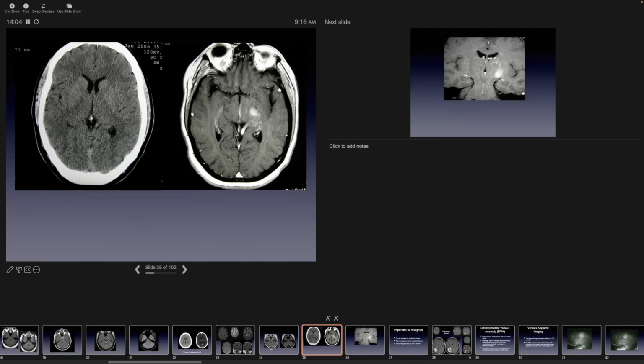A second option is to do one of these MR tagging scans where you can determine if there's AV shunting. Not typically done, but you'll notice on susceptibility weighted imaging, oftentimes you'll see a difference in the appearance of veins and arteries. So even a standard SWI scan can often help you in making the distinction. And then, of course, the last resort is to do a conventional angiogram, which is not the end of the world. These are often young patients, and the risk of cerebral angiography is really quite low.